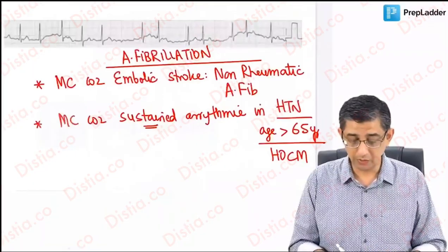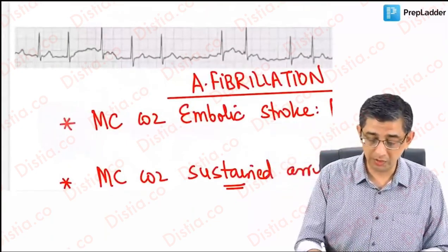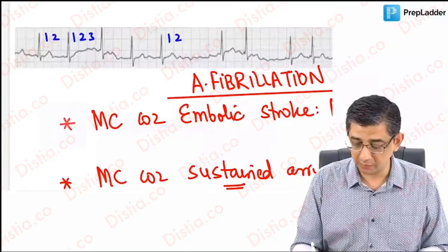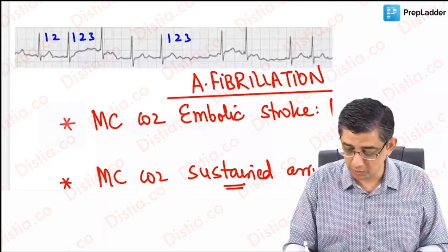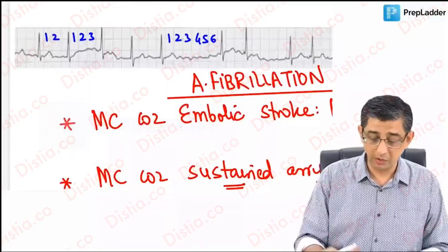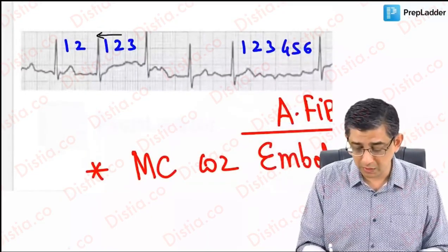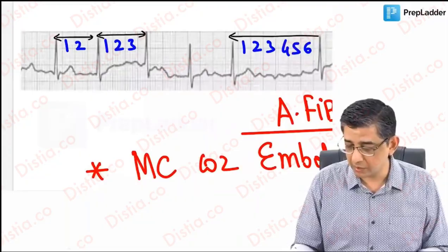So I'll just focus on the ECG that I showed you earlier, and I want you to notice that if you look at the number of large squares between the R and R waves, I'm just highlighting those large squares, which can be easily deciphered by you, because lots of times I understand the resolution issues can be there. Now look at the huge disparity. It's obviously more than 3. It's about 3.5, 3.6. But I just want to highlight with the help of these arrows that you can notice the huge disparity in the RR interval.